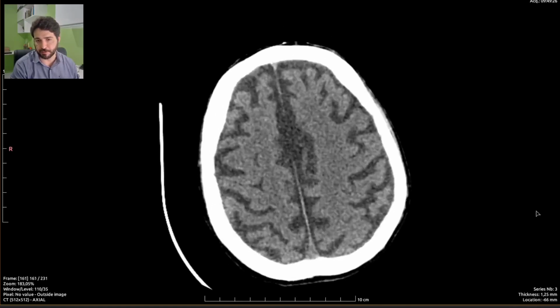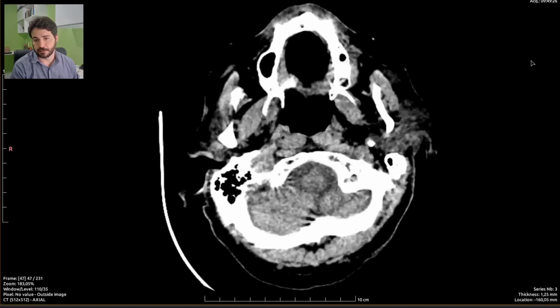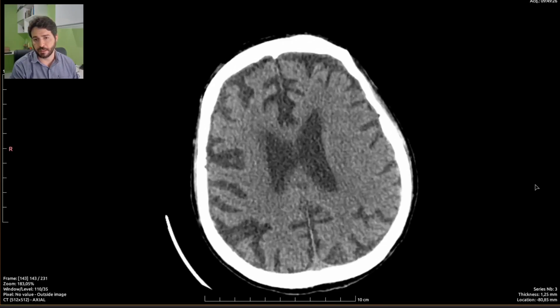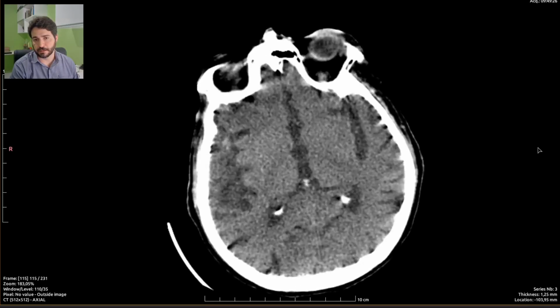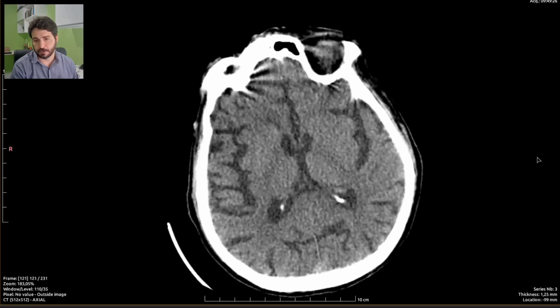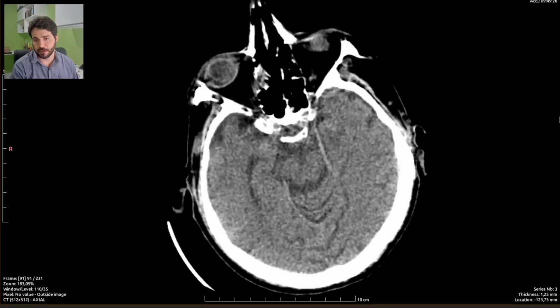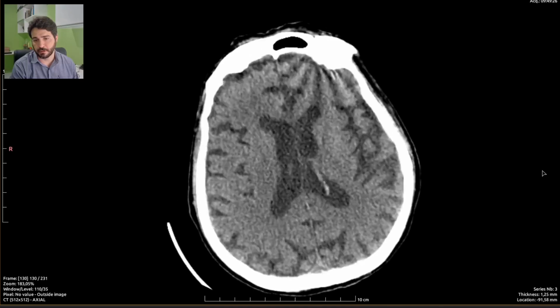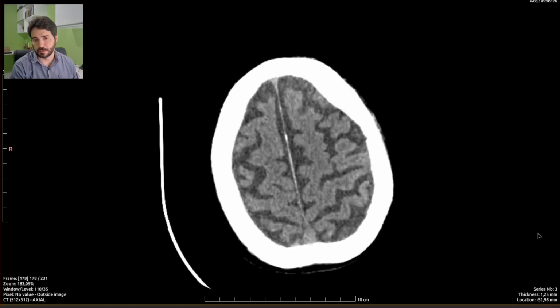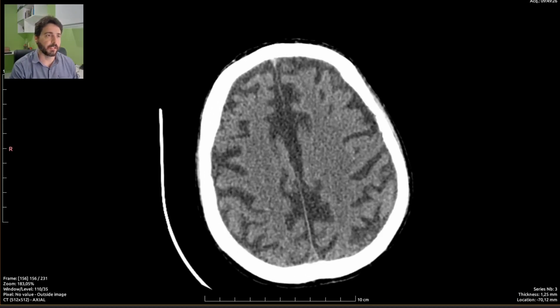A very, very badly done CT scan of the head, but I can readily tell you there are no signs of stroke. Not hemorrhagic stroke nor ischemic stroke. So there is no actual bleeding that I can see. This is just old man's brain.